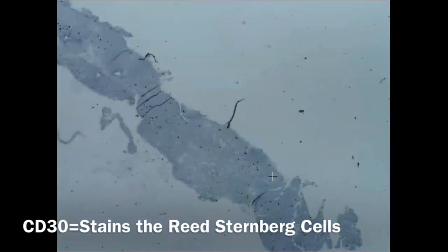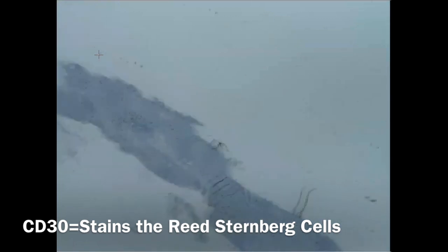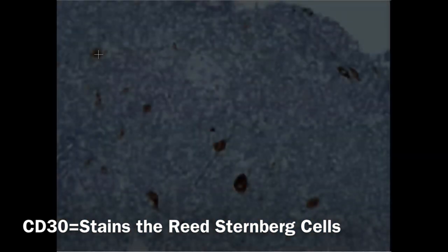Okay, I'll get back to CD20 later on, but let's see the special stains that we need to order for a Hodgkin lymphoma. First, and the most important, is CD30. And CD30 in the classic Hodgkin lymphoma, it stains the Hodgkin cells. So as you can see here, we have some dots, and these dots correspond to the Hodgkin cells. So number one, CD30. I will go on a higher power to show you that these cells, they are really big, and they are the Hodgkin cells that we saw on low power.